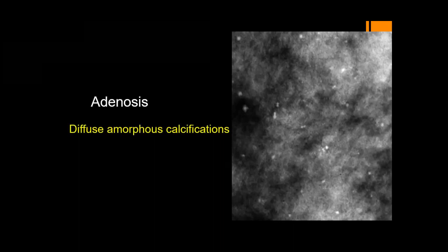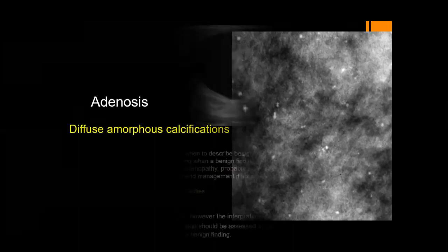Okay. What is your comment about this BI-RADS, this image? Part of a mammographic image demonstrates diffuse calcification. Diffuse is scattered. Amorphous. But the morphology, amorphous, excellent. Amorphous, diffuse scattered calcification. So it will be BI-RADS? BI-RADS 2. BI-RADS 2, excellent. Usually seen with adenosis. Diffuse amorphous calcification.